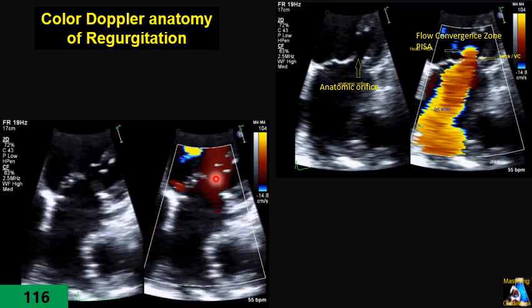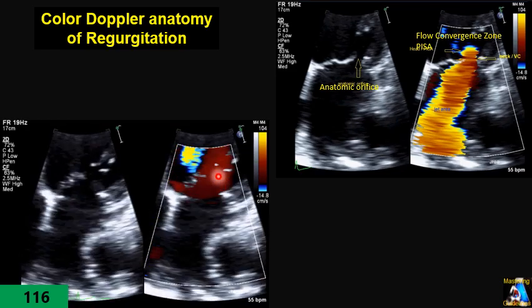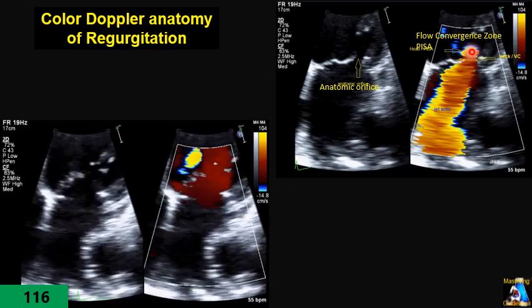If you go a little farther than the circular shape from the orifice, it becomes more elliptical. If we go closer to the orifice beyond the circular shape, it becomes more flattened. Later we will talk about what causes this and what its effect is on our measurement. Here we have the head, or PISA.